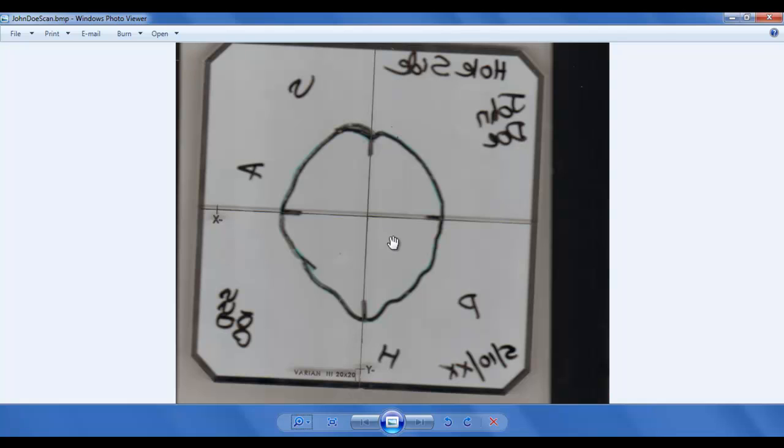The key thing with the scan, make sure when you scan your image, the X minus mark is to the left and the Y minus mark is to the bottom of the page. PD is going to require that it is oriented pretty close to that orientation. You'll notice my block is a little bit tilted in this scan. That's okay. PD will take care of rotating it and scaling it for me.